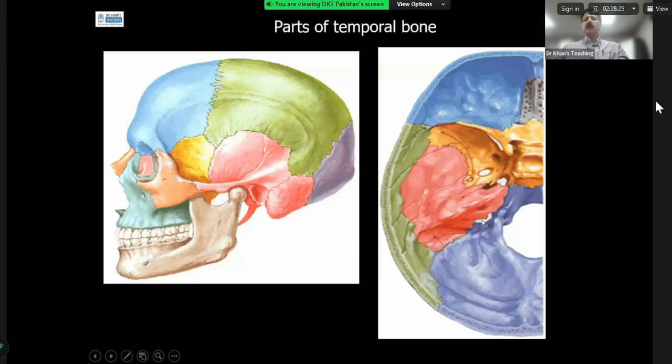The contents which pass through the jugular foramen, as the name tells you, include the internal jugular vein. But with that, there are 3 nerves: the 9th, 10th, and 11th nerves. Now, the name pars nervosa suggests that nerves are passing through it. Having said that, only the 9th nerve passes through it. The 10th and 11th pass with the internal jugular vein in the pars vascularis. So you don't have to remember it, but it's a good idea to see the shape, and we will cover it on a CT scan. So this is the jugular foramen.